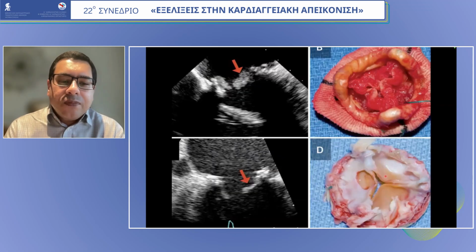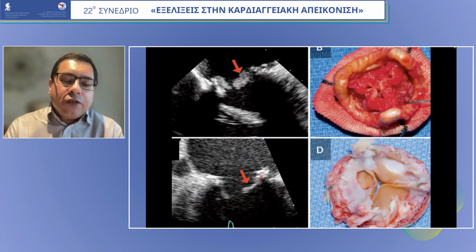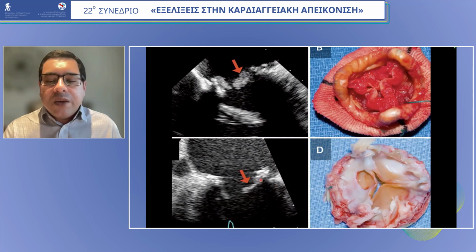And that's what you saw in our case just a few minutes ago, with the thickened valve leaflets, reduced mobility, and increased gradient. And this is some of the histology, where here's a picture at the top with a clotted valve you can see in the red just there, and that's a typical valve with thickening of the valve leaflets. Whilst for pannus is very different, the valve leaflets are often quite thin, and you have a very different echocardiographic appearance.